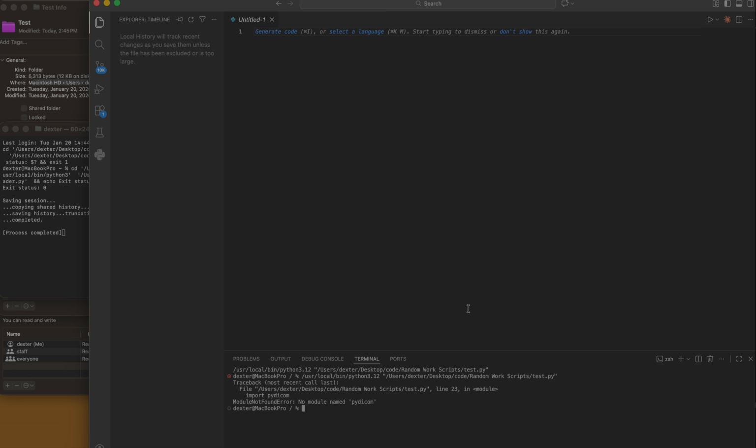So if you've read the LinkedIn post, the prompt that we're going to be working under is we want to take a DICOM file, so say some QC images from a gamma camera, and convert those into an Excel file.